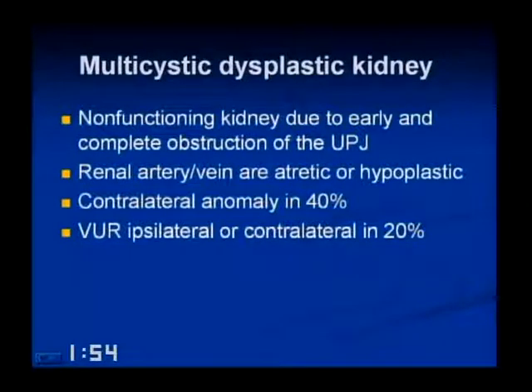As Dr. Fernbach mentioned earlier, on prenatal sonography, some things just disappear. Sometimes, as with cystic adenomatoid malformation, the cysts get much smaller over time, or with infradiaphragmatic bronchopulmonary sequestration, those tend to disappear. Sometimes these multicystic dysplastic kidneys get much, much smaller during gestation and can actually disappear completely.